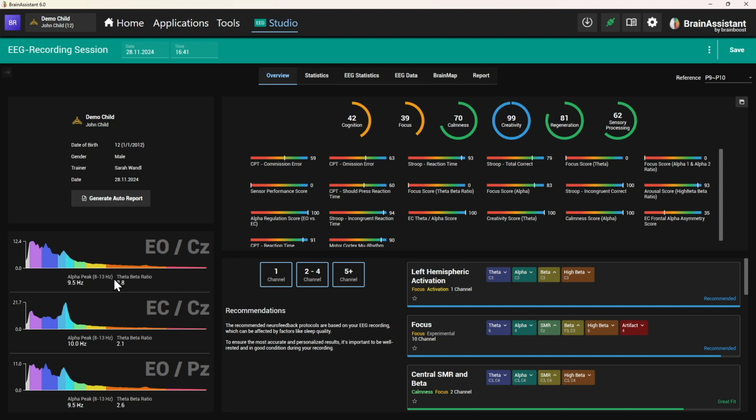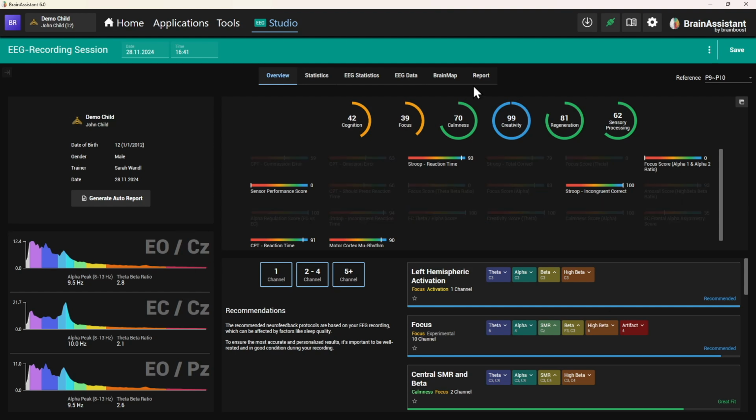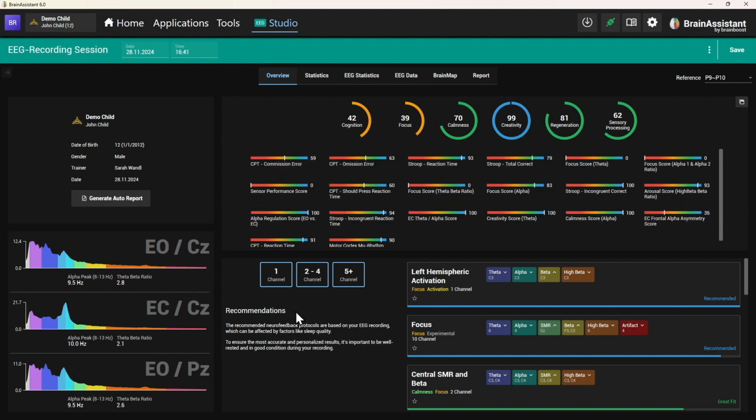What else do we see? We see here on the left side an FFT analysis. So for people who are familiar with FFT, this should be pretty straightforward. At the bottom here, we see the frequency bands, and then here we see the amplitude. For example, purple is delta, then theta, alpha 1, alpha 2, low beta, mid beta, high beta, and gamma. And we see here, even though this is a measurement from a 24-channel recording, we just see the most prominent positions for a first glance.